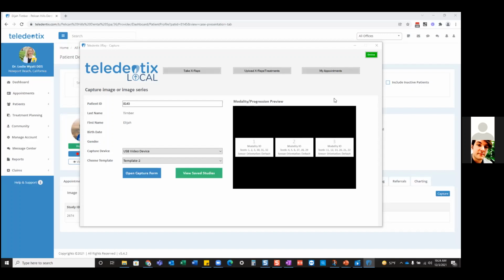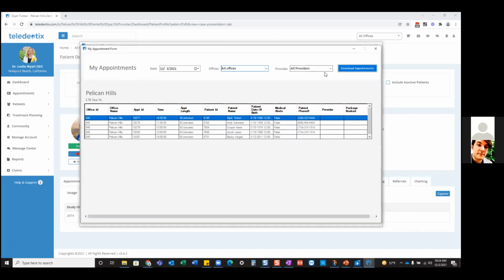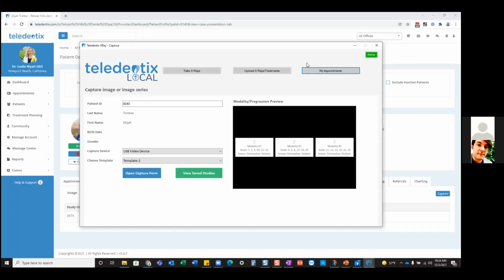So you do have to go to My Appointments first and download your appointments. Always, always, always. So definitely make that super high priority. I'm going to do this the week before, go ahead and do that. But yes, you do have to download before you have any access to the offline feature.